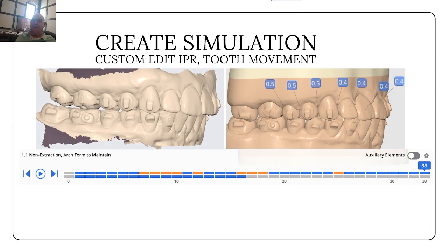In this case, the patient was unsuccessful. Well, she was partially successful in correcting a big class 2, but it's still maybe not exactly the best bite with a little posterior open bite. So I wanted to see what could I do with just IPR in the upper. Just accept the posterior bite the way that it is. Do some upper IPR to reduce the extra overjet. And so I use Medit Orthodontic Suite to do that.